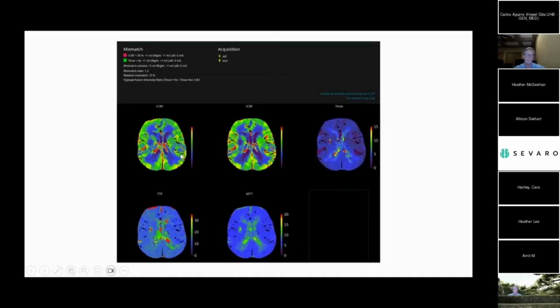Now, I told you earlier, I think I told you, CT, yes, I did. CT perfusion does have a hard time with really small strokes, such as lacunar infarcts or basal ganglia strokes. So one of the things they claim is that they're better at picking up these small strokes than some of the other competitors. To show me that and to show you that, they gave me a case that shows a stroke at the basal ganglia.